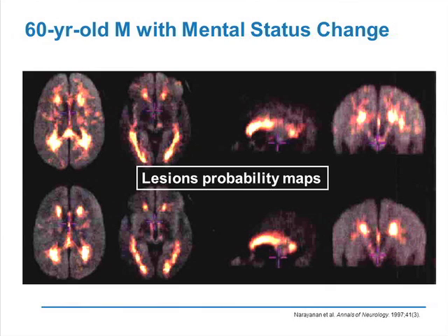The preponderance of lesions in multiple sclerosis should be around the ventricles, but you can have some that are outside. Therefore, if you had a patient whose preponderance of lesions were in subcortical areas, you may want to raise the question whether it really could be multiple sclerosis.